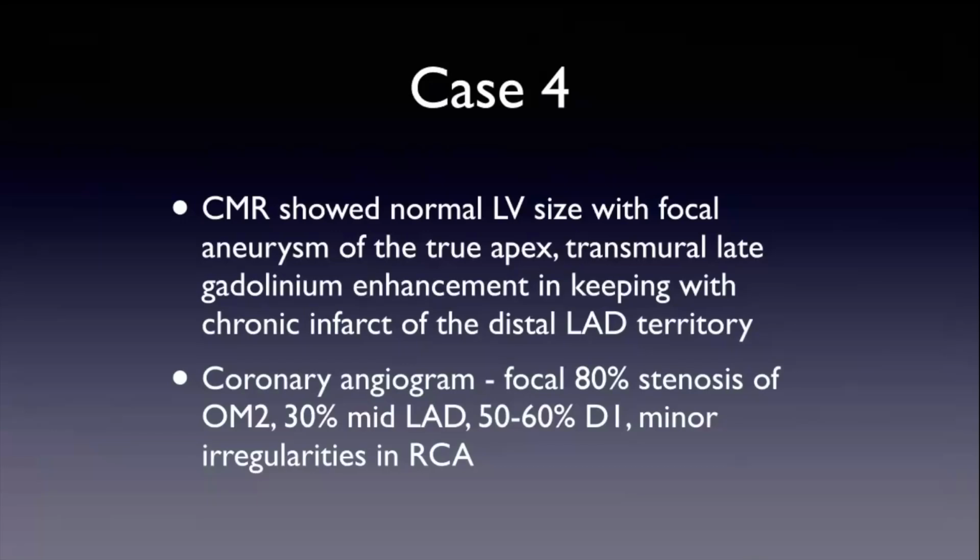Could it be embolic? That's also a possibility, I guess. For sure we saw the LAD wrap around the apex in this. I can't remember the exact anatomy, but don't forget, most LADs do wrap around the apex. The question is how much around the apex it wraps, right? Okay, all right.